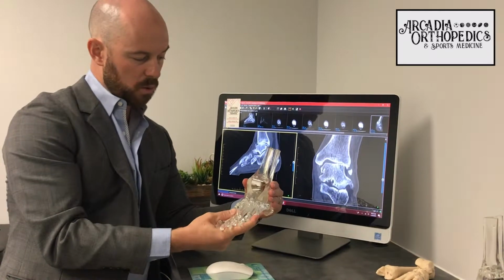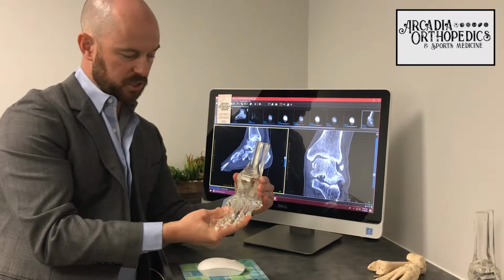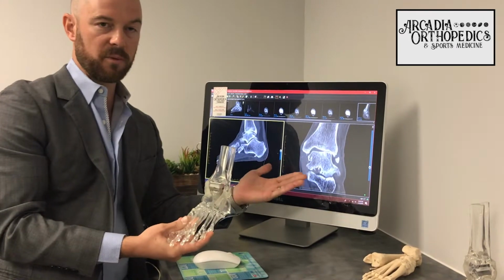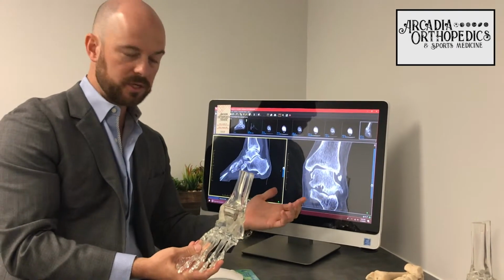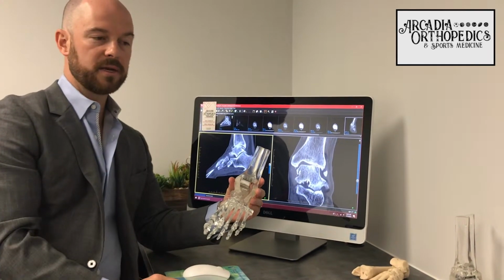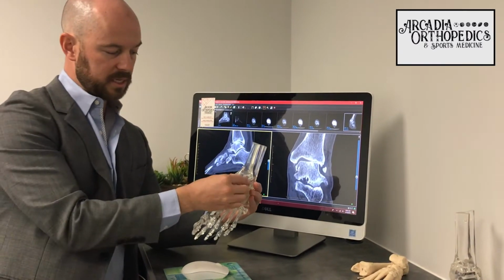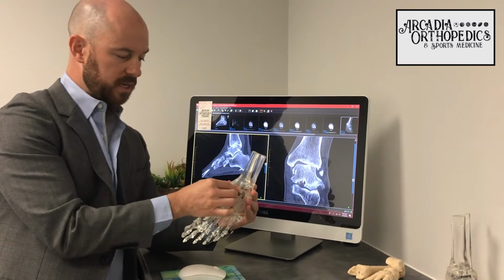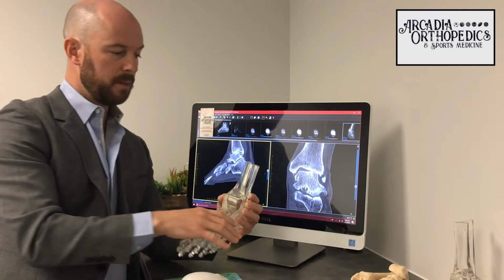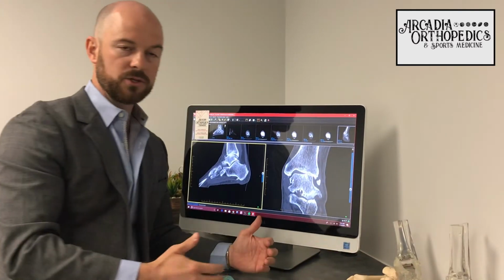This is a mobile bearing device. You can see the plastic piece in the middle is a little unsettled when the patient's foot goes into valgus or leans in. This ankle doesn't tolerate this deformity very well. It can in the right patient, but the patient has to be non-obese, perfectly healthy, and limited activity. So this ankle implant is mobile. You can see the plastic liner pops in and out. And it's very easy to replace, and in most ankles that are parallel or congruent, it's a great option. But for patients like this, we're really going to lean towards a semi-constrained total ankle.